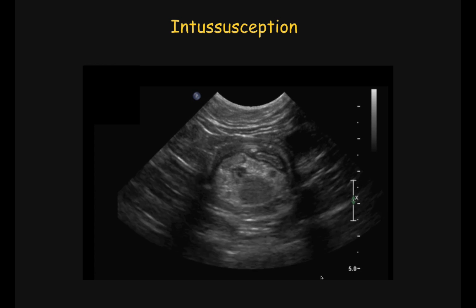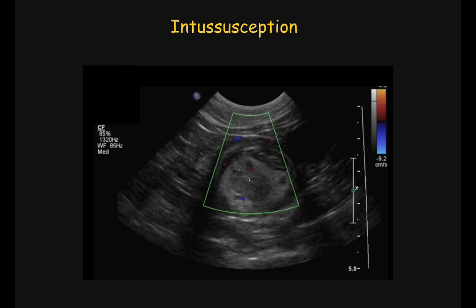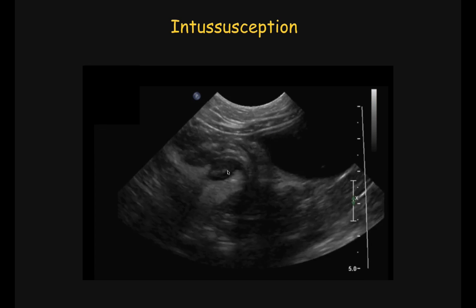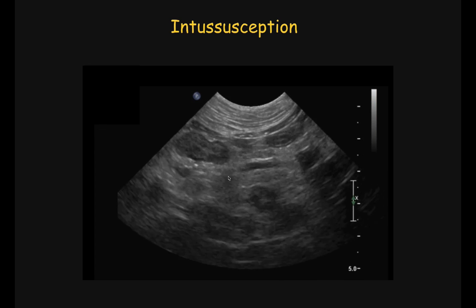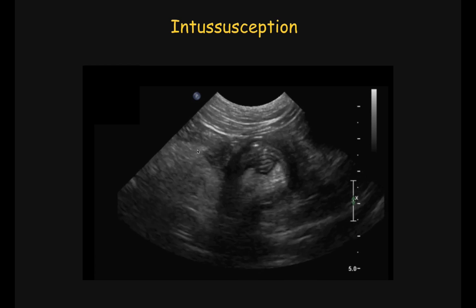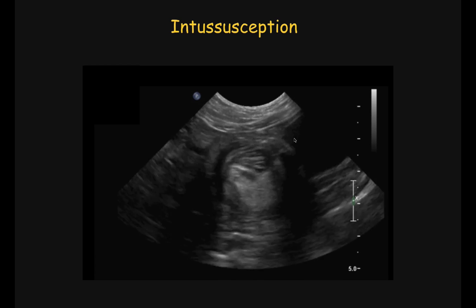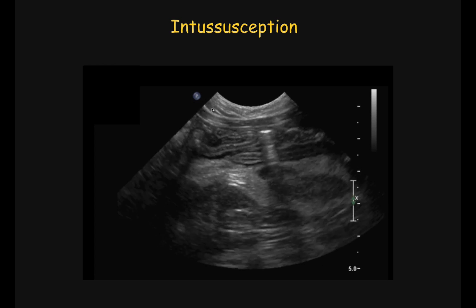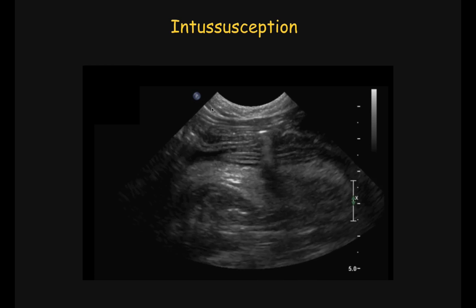We maneuver along the intussusception, again 2 jejunal lymph nodes, the inner segment, and now we are out of the intussusception. We see part of the bladder, indicating that the intussusception is actually caudally located.